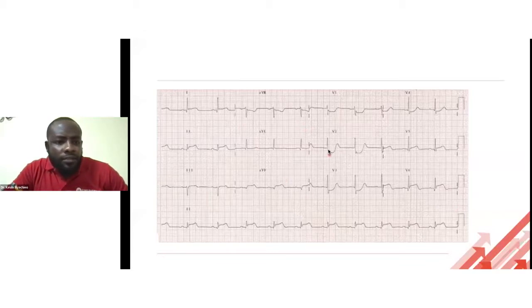Is there any ST elevation? Okay, yes, starting with L2. Twalib is saying starting with L2. Is it an ST elevation or is it an ST depression? So you're saying L2, okay, I agree. There is an ST elevation.